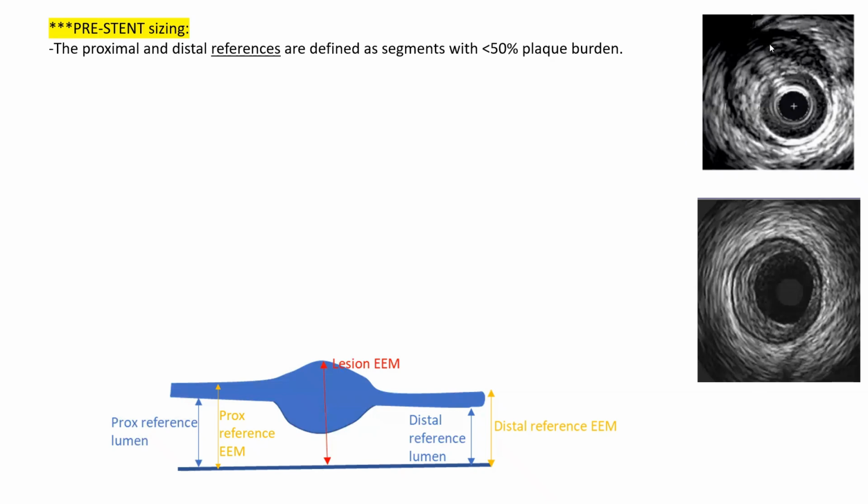However, that doesn't mean that this needs to be stented necessarily. Only if you have a tight stenosis next to this and you need to stent, you probably ideally should extend your stent to a healthier area than this one.